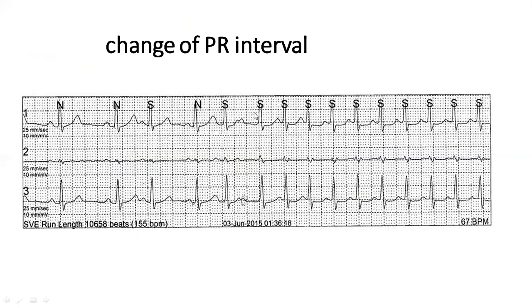So this is the first beat of the tachycardia. What has happened to the PR interval? There's a huge change in the PR interval as compared to the PR interval in the previous beats. If this is a short PR interval and it is going through the fast pathway, then this one is going through where? The slow pathway. And in this QRS, where is the P wave hidden? Here it is. So pseudo R and a pseudo S in a Holter monitor.